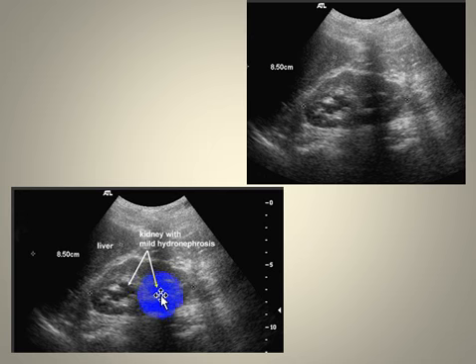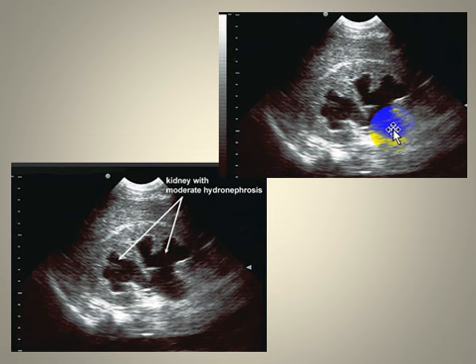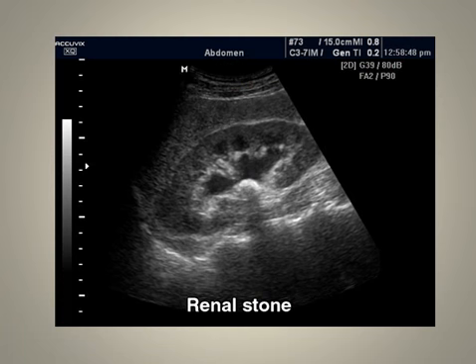Here there is a mild hydronephrosis, only you see the distension of the pelvicalyceal system, good cortex, also normal, you see the normal variant fetal lobulation. Here it is moderate hydronephrosis, you see dilatation of renal pelvis and dilatation of the calyceal system, and there is no significant cortical loss.